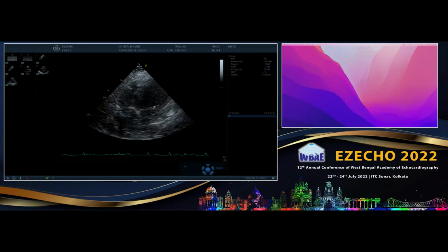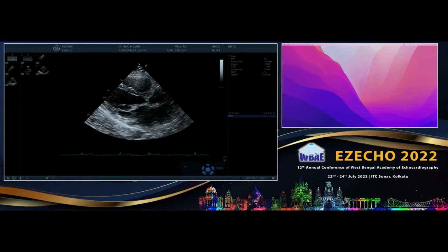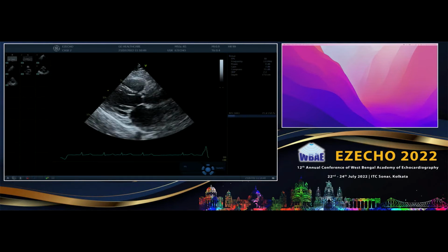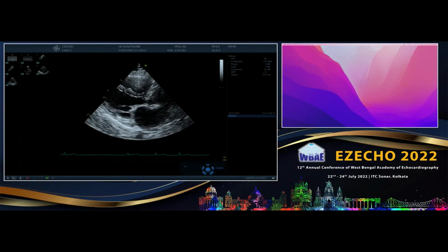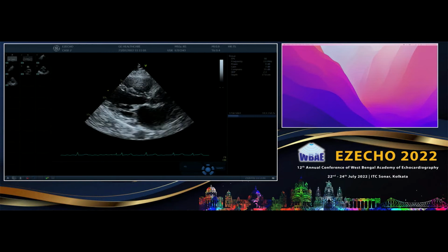You look at the volumes. We did the volumes first. From the volumes, you know whether that particular chamber is pressure overloaded or volume overloaded. So you know whether there is a regurgitant lesion or not. Look at the wall morphologies in 2D. We are in a lot of hurry to put the color Doppler and we miss a lot of information. Color Doppler is not an ultrasound angiogram. Just by changing the variance, by changing the Nyquist limit, you can turn mild MR into severe MR.